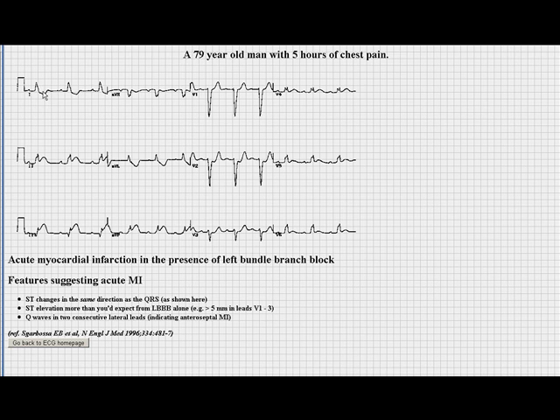There's something that's changing. Now this can happen normally in young people. This can happen normally in certain races. The key difference is did this change from a normal ST to a depressed ST? And that's where you'd want to go to that video. Because what's going to happen in that situation is basically if repolarization is changing, it means certain parts of the heart are not flushing out their potassium, are having difficulty repolarizing, and that's changing the pathway of repolarization.